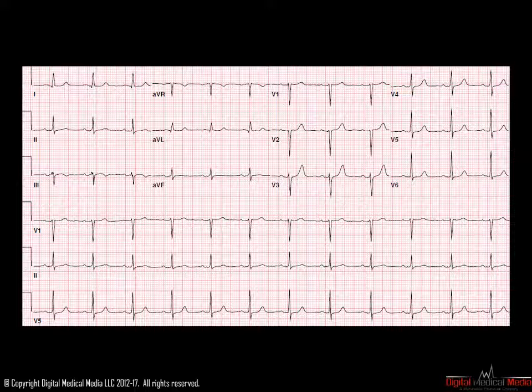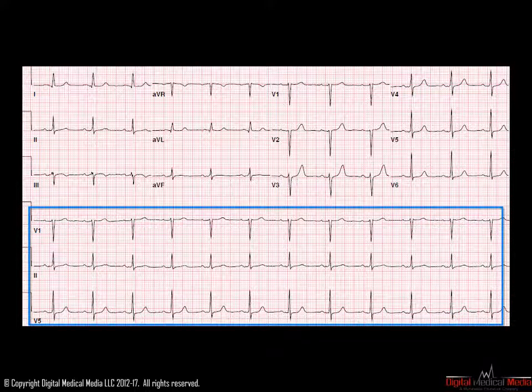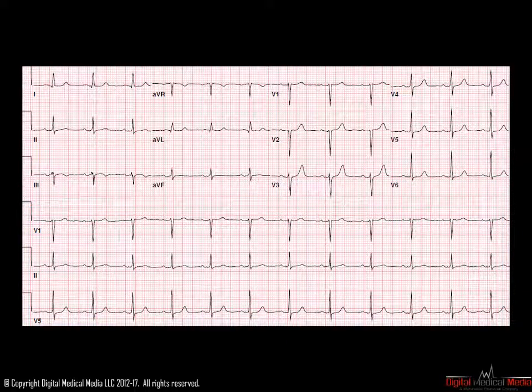The final thing which is notable on this 12-lead ECG are the 3 continuous tracings at the bottom of this strip. These 3 leads were determined by a setting on the ECG machine at the time of the recording and represent what is called a rhythm strip. They allow the reader to look at the same lead across the entire duration of the recording to detect nuances in the rhythm itself. These are additional to the 12-lead ECG, which is present in the tracing above.